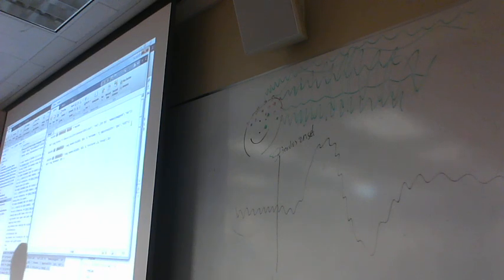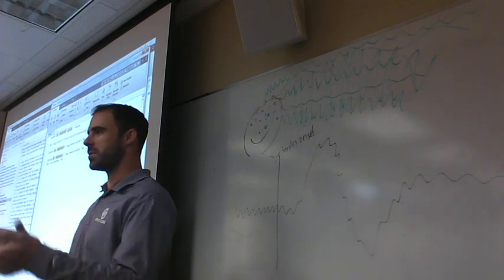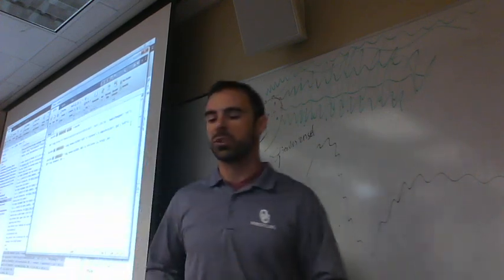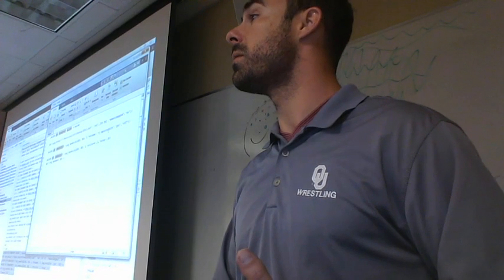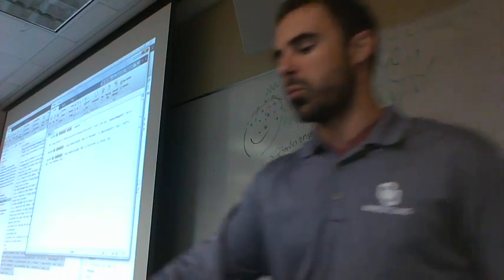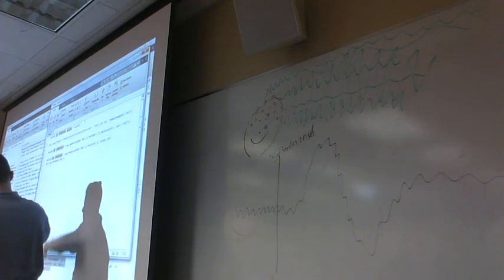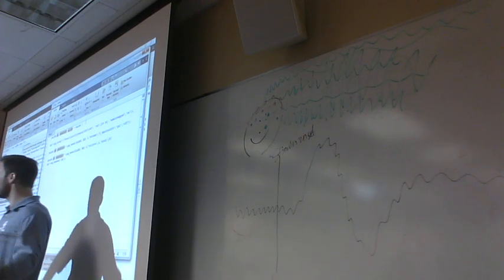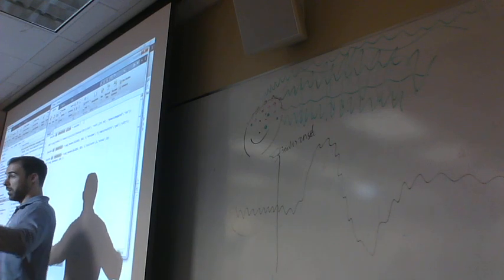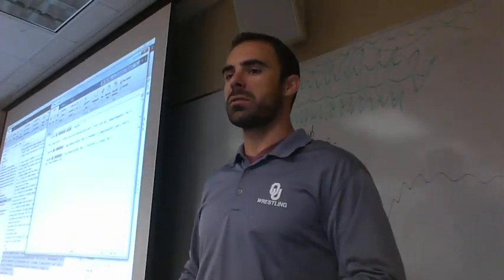So anyways, one thing we can do, and this is the reason I'm introducing this now. Last class I waited till like the end of the semester to start to teach you how to code. But this is a really nice way to keep track and take notes about what we did. Here's how you do that. To the right of the semicolon. This is basically a little script that if we ran this and typed this in here, it would do exactly what we already did.